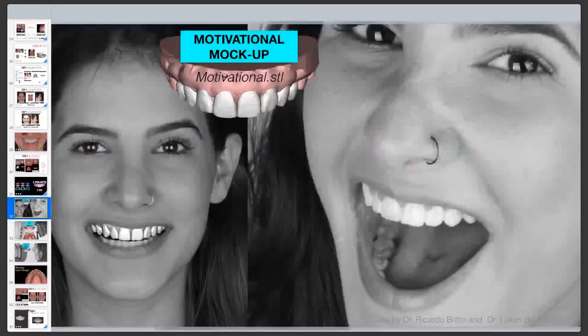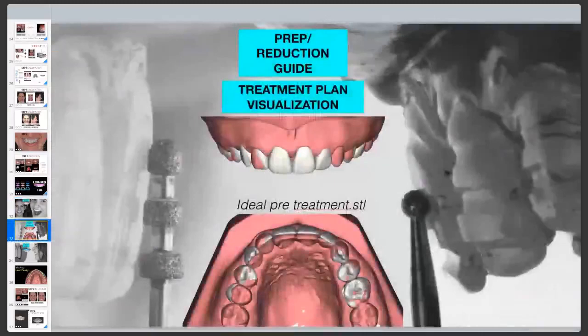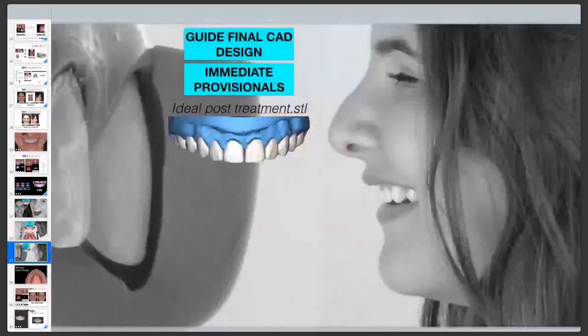The ideal design, which is how we start, right, we can use as a prep, like a reduction guide, and it also helps us to visualize the planning, as I said. So depending on the case, it really helps us to see which areas we need to prep more or less teeth to provide a more minimally invasive dentistry. And the ideal post-treatment, we can use for immediate provisionals and to guide the CAD/CAM restorations.